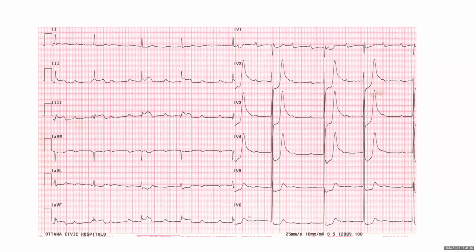How about heart block with no regular RR and no regular PP? PPs are regular. And then this beat, you're right, might be a bit early.